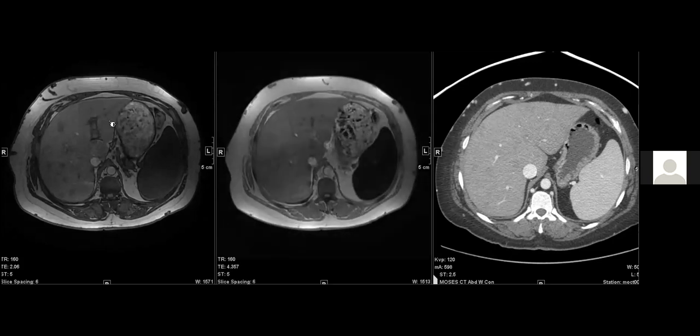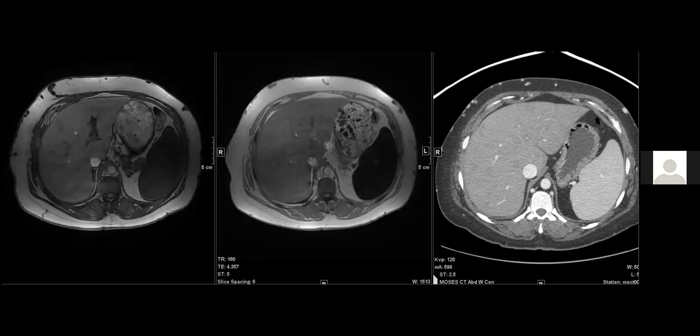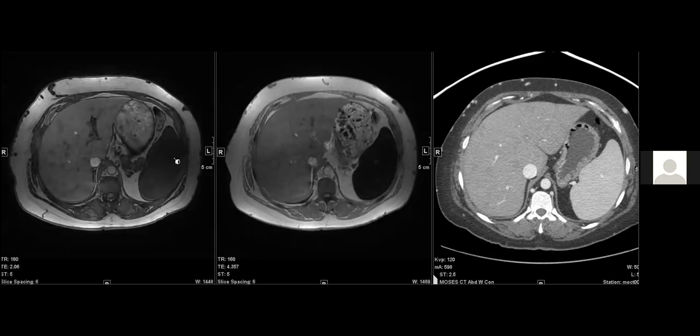So now you can see the difference. And you can see that the spleen still drops. Unfortunately, I can't do four like this, so I'll bring it up in a second. But you can see that on a 1.5 Tesla scanner, when the in phase is acquired as a second echo, the spleen, which has iron, drops on the in phase.